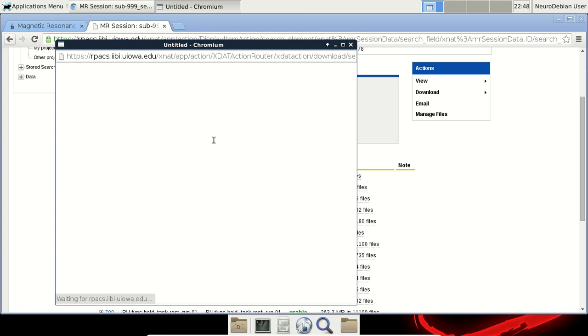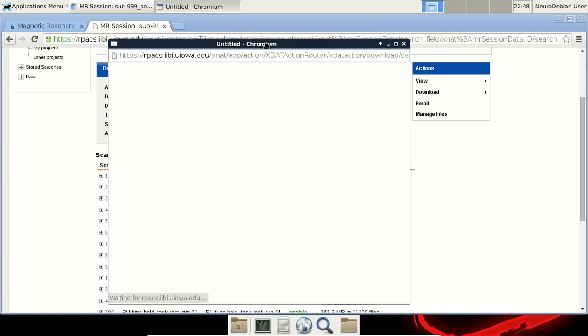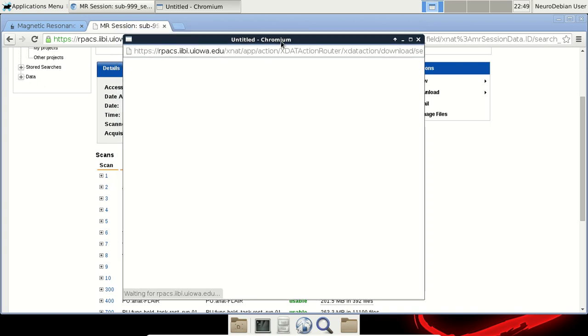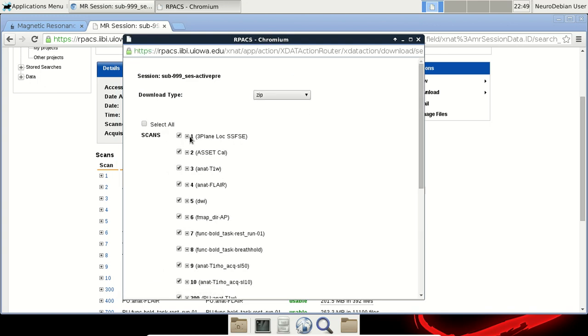Okay. So this is the method that you have to use if you have collected data outside the class. And eventually this will load. It might take a little while. And you'll need to do this for each subject. So if you can't tell already, this method can take some time and is not very well automated. But it is automatable if we name our files consistently.